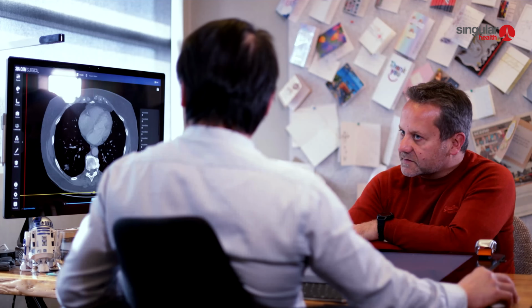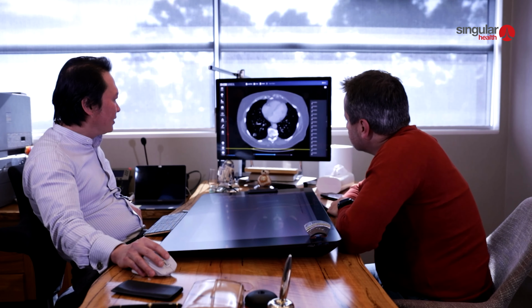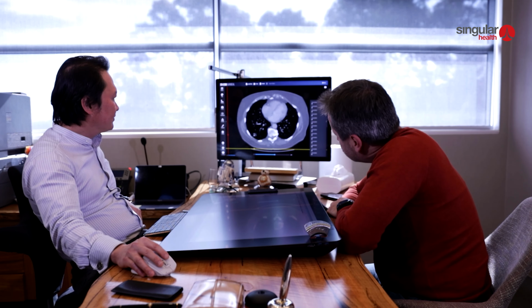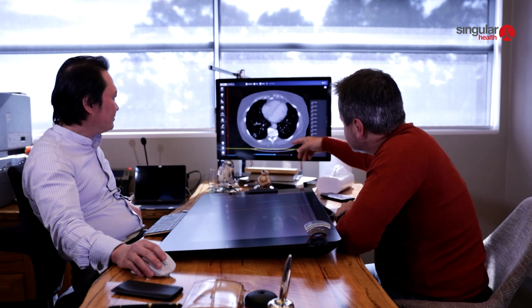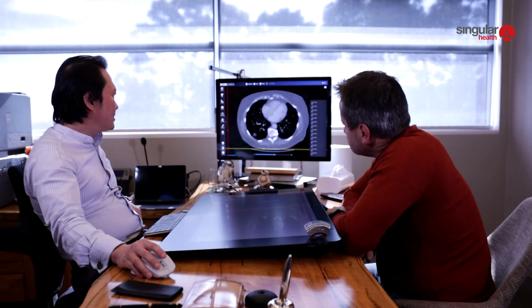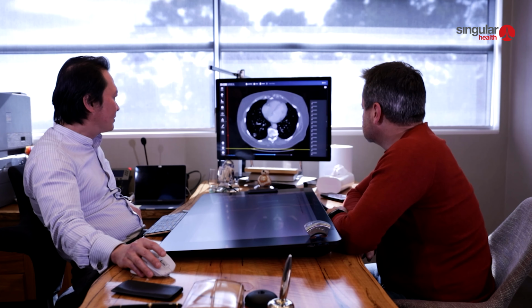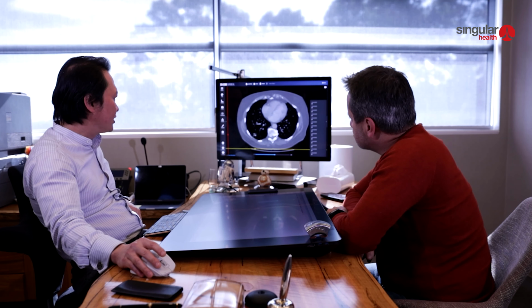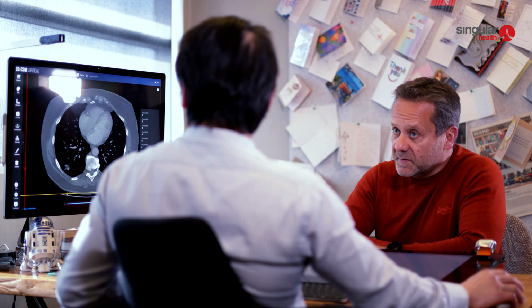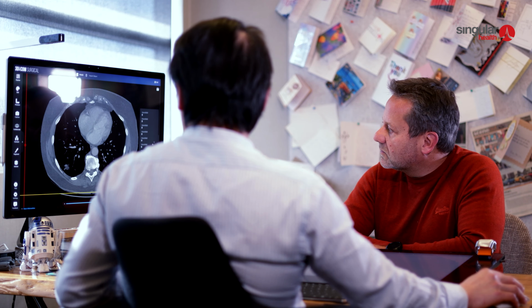A lesion? What does that mean? Well, you can see a little growth there. Can you see there? I can see that growth there, but I've got to be honest with you, it looks no different to the other little lumps there to the untrained eye. Well, it's a little bit different color, and the shapes are irregular, but perhaps it's a little bit difficult to appreciate this in 2D, so I can show it to you in 3D. You can show it to me in 3D? Yeah, I can. So if you just bear with me, I'll just load it up in 3D.